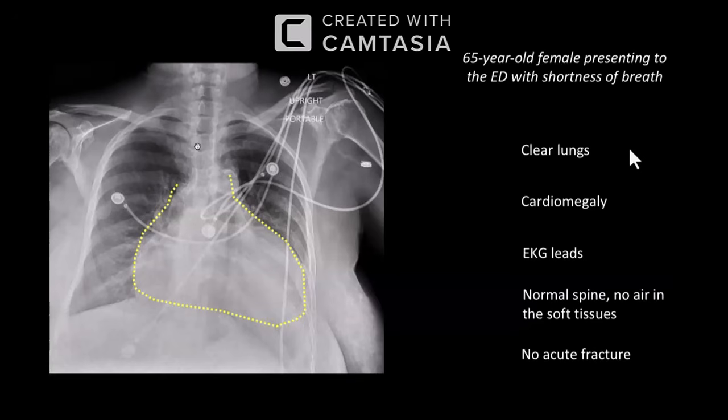The trachea is central. There is definitely mild splaying of the carina, and some degenerative changes in the humeral joints. So yes, the next step in this case has to be a 2D echo, and then a referral to cardiology as well as the ICU team.